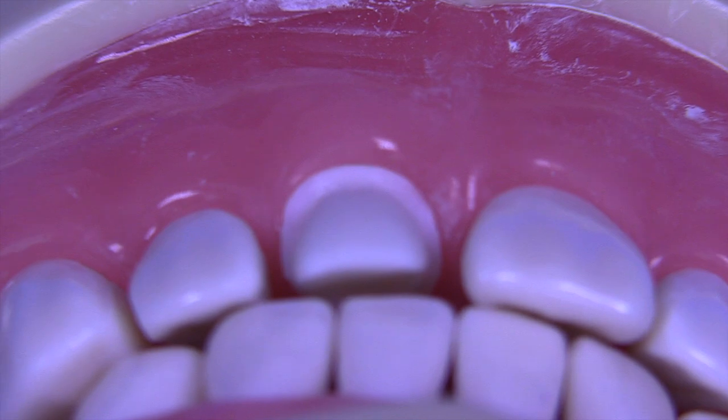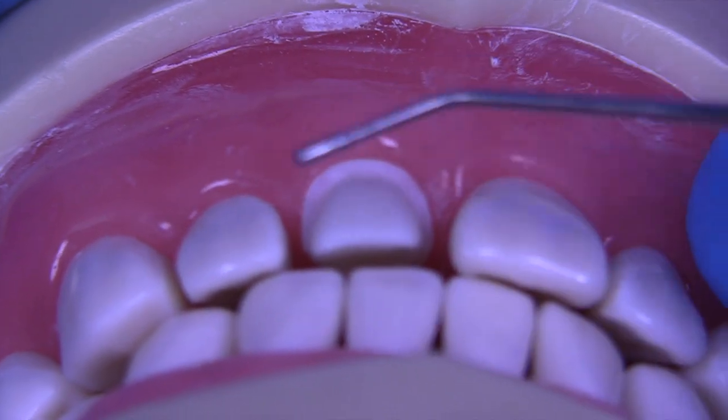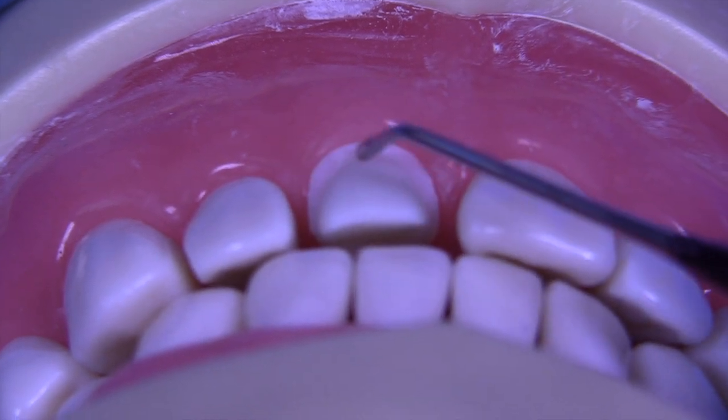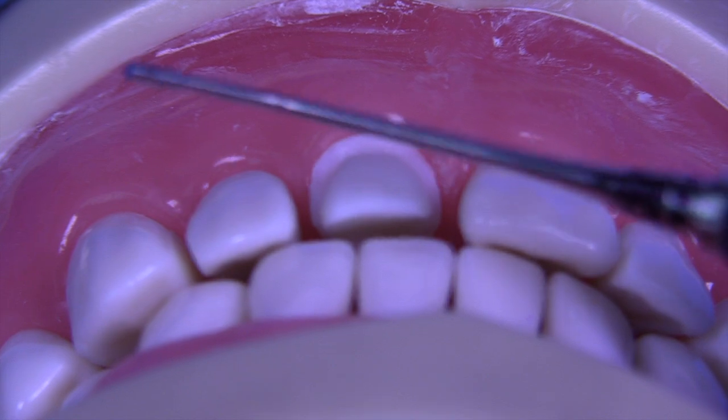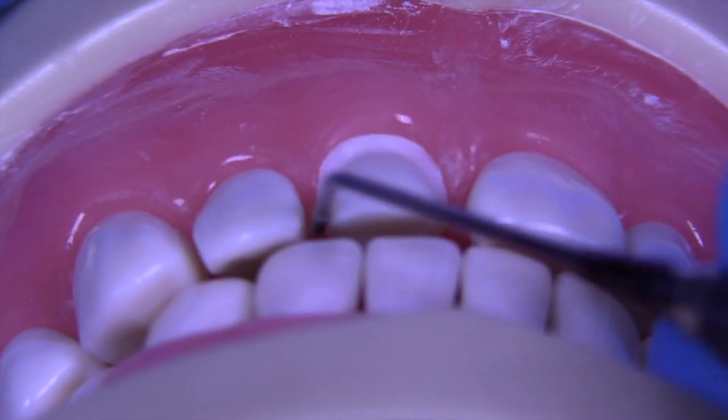What about the reduction of the shoulder? Does the shoulder look good to you? How much reduction is there here? And the answer is it looks fantastic across this area. This is 1 millimeter, but it gets too narrow right here on the distal, as we mentioned earlier.